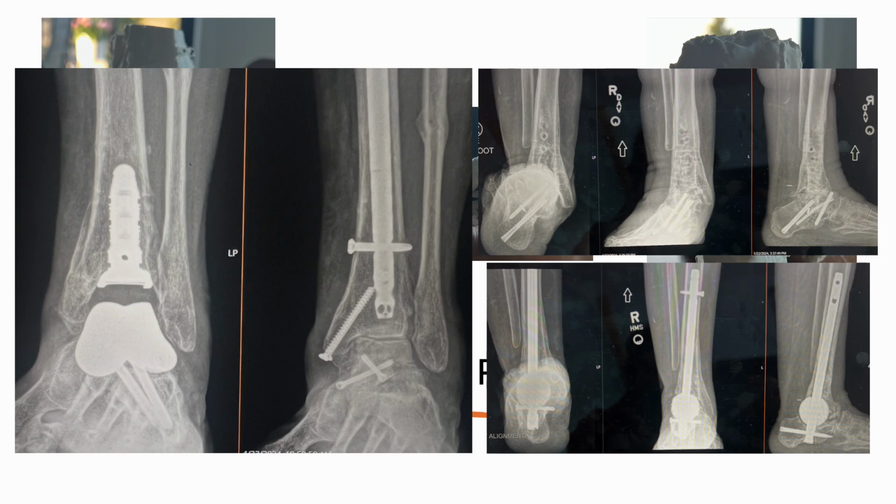I hope you all enjoyed the weight-bearing CT scan talk and that maybe you can bring this to your practice. All right, guys, let's conclude this talk. I do believe weight-bearing CT scan is the new standard for advanced imaging. If you can find one in your area, you can get your clinic or your practice to buy one, I would highly recommend it.